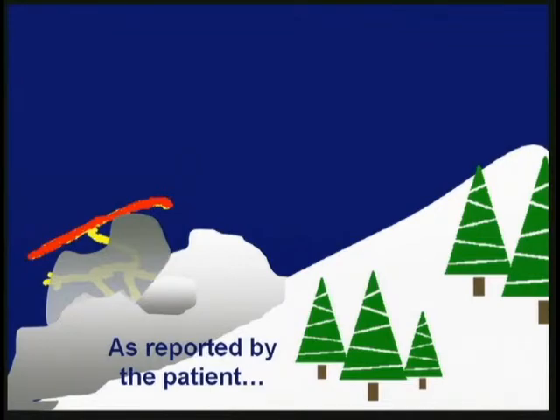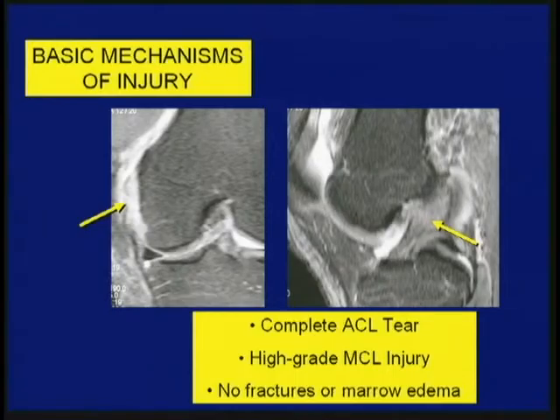It was all distraction. And so when we imaged him, in fact, this is what we saw: a lot of high-grade stuff on the medial side to your left, a lot of stuff in the cruciates to your right, no marrow edema because the bones had been pulled apart. So if you see a lot of ligament problems without marrow edema, you have to think of distraction.